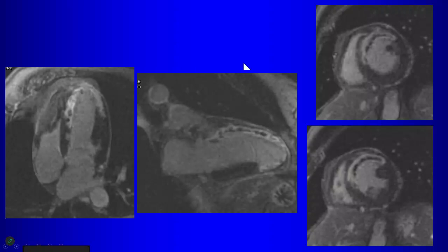Okay. Yeah, and the normal myocardium, the enhancement is past that area already, like the gadolinium is washed out, right? Well, the sequence is done. Remember, we do this with an inversion recovery sequence to suppress the normal myocardium, right? So there is going to be some gadolinium within the normal myocardium, but the sequence is set up to suppress the signal from the normal myocardium. But you're right, the washout from the normal myocardium is faster than the washout from injured myocardium, okay?